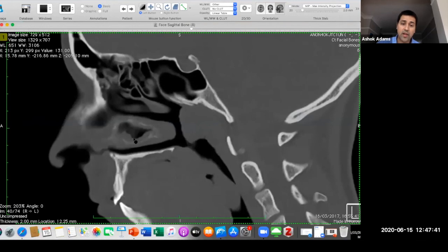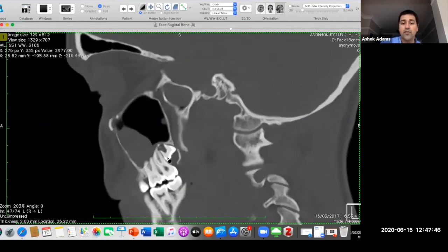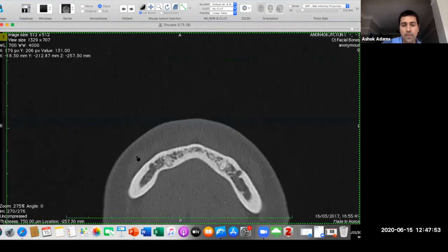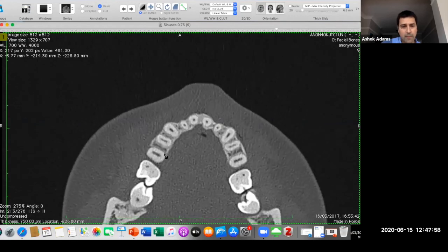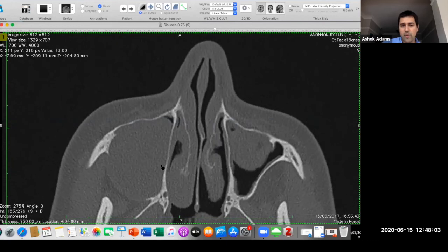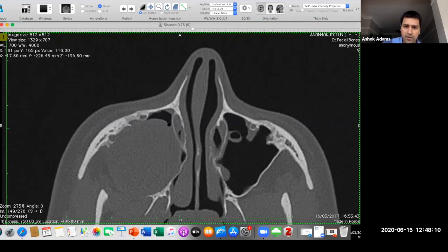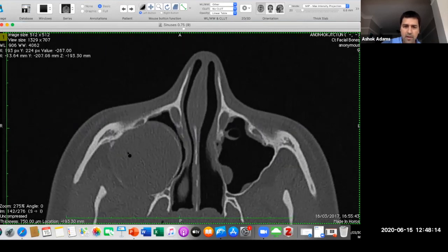And as you know, you don't really want to operate on maxillary sinusitis when it's been driven by a carious tooth. You want to have the dental findings addressed first. One of the other things to be wary of is an opacified maxillary sinus. This patient will show you what can happen once you've had a dental extraction. If you're scrolling through, you might think that's maxillary sinus opacification. One of the things is always to look for little thin bony rinds. You can see there, I don't know if you can appreciate, there's some remodeling there. Yeah, so you can see a thin line of bone.